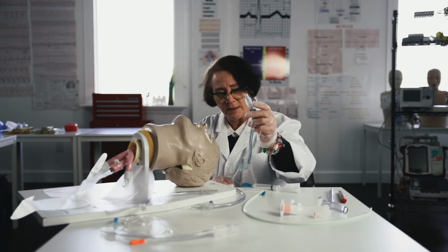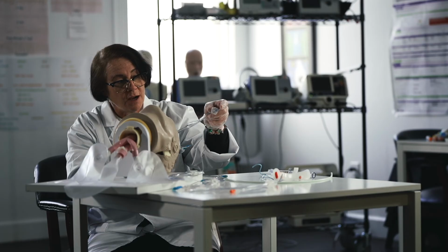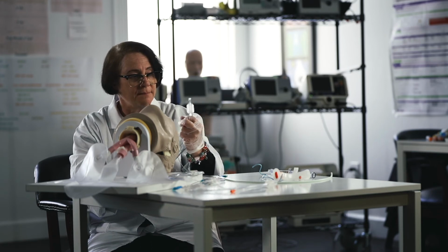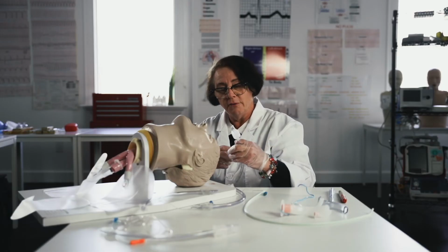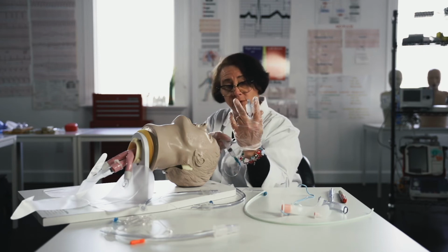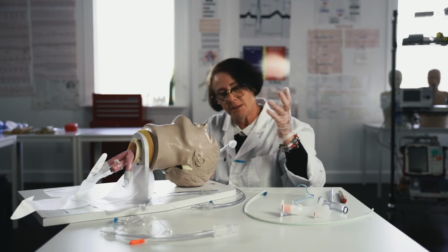At the end of an endotracheal tube, you're going to see a little balloon or a cuff. The balloon's job is to simply prevent air and oxygen from escaping around the tube. This balloon doesn't hold the device in their body. If your patient has a Foley catheter, a urinary catheter, a Foley balloon is an anchoring balloon. Our bladder is shaped like a V, so the balloon full of water in this case prevents it from getting pulled through the urethra and anchors it. Endotracheal tubes will be anchored externally with tape or Velcro, little devices.